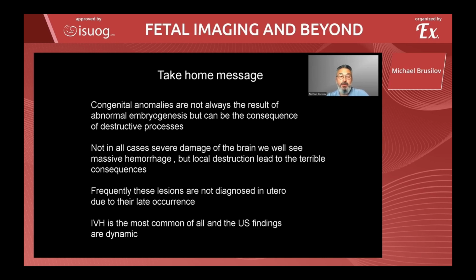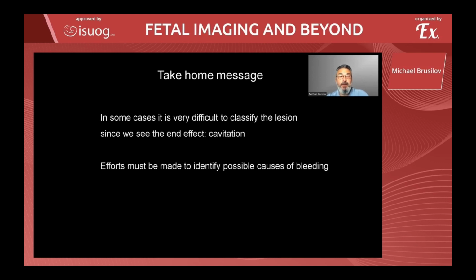IVH is the most common of all, and the ultrasound findings are dynamic. In some cases, it's very difficult to classify the lesion since there is an end effect, cavitation. Efforts must be made to identify possible cause of bleeding.